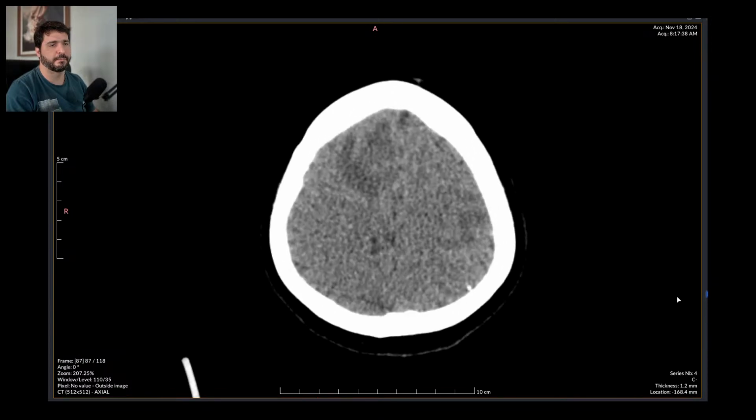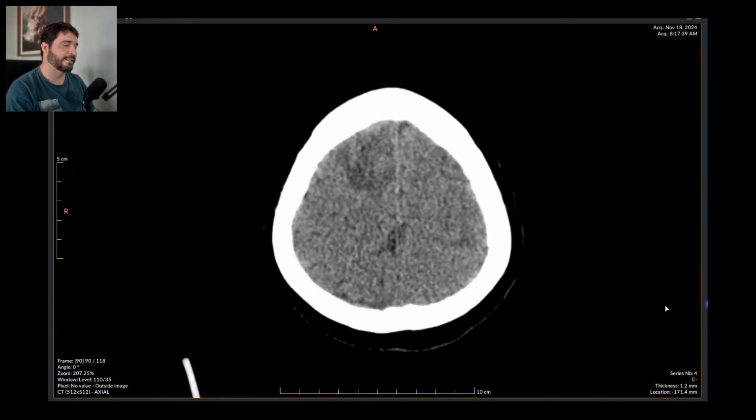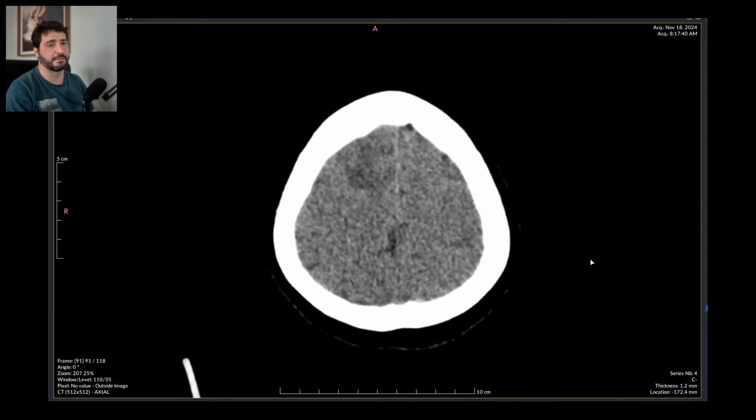oh crap. Oh, this is just brutal. This Monday is one of those, guys. See this and that? This is not a stroke. This is definitely not a stroke.